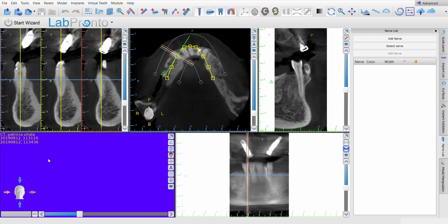Now if the patient was not in a proper position, you can change the position of the patient in a proper setting. The position that you want to keep is parallelism to the floor. That's what you're looking to do. If you see that the patient is a little bit cockeyed, a little turned, or a little sideways or up and down, you can try to correct that yourself with these arrows.